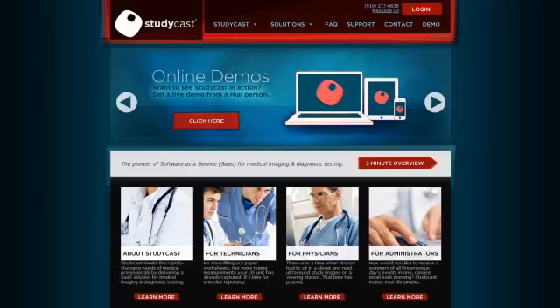Welcome to Studycast. This video will provide you with a brief walkthrough of Studycast's features, allowing you to begin reading studies in just a few short minutes.